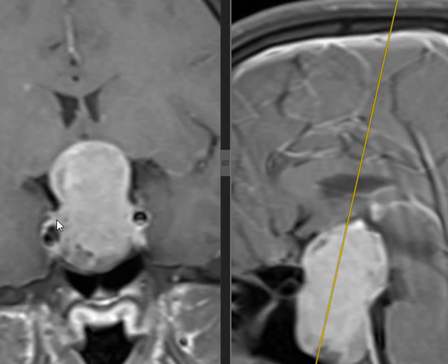Second, differential diagnosis of the sella. By the way, what sign does that lesion present? Snowman, also called the waist sign, also called the figure of 8 sign. It looks like the number 8 in the coronal or even in the sagittal image, or it looks like a snowman.